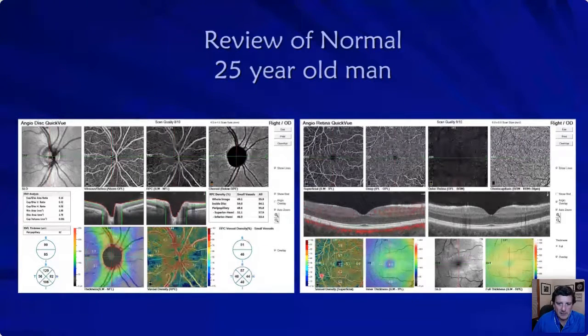And another area over here is where the ganglion cell complex is. We can see how the macula is functioning. So these are just different scans that you can pick up on the optic nerve or the angio disc. Here's a retina scan, again looking at superficial, deep, the outer retina with no blood vessels, and then this choriocapillaris, picking up density, seeing what's happened to these capillaries.